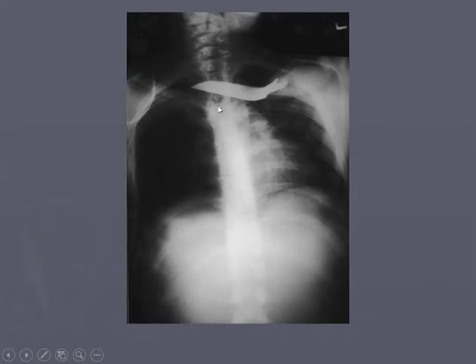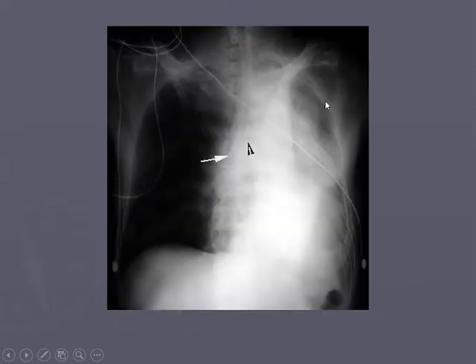But you'd expect to see a pneumothorax if it went through his chest right there, and you're not. You're seeing the gray tissue of his lungs there. So I wouldn't say that's penetrated into his chest cavity. And in fact, like I said, it just went across his back and didn't penetrate anything because of the cheap knife.